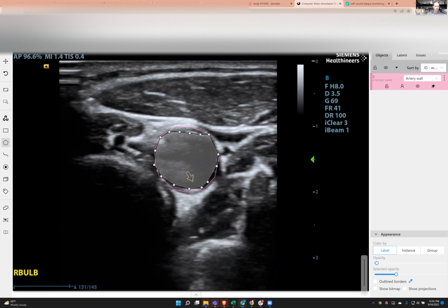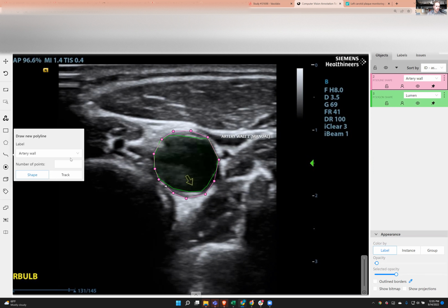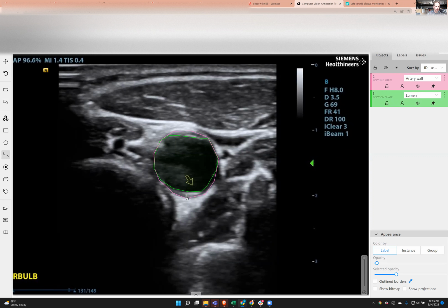Let's measure this down, hit finalize, and then move this dot down a little bit. Then let's measure that plaque thickness. After I measure this, there's a QC process where we have somebody else go through it, validate all the clicking, and we release it out to the patients.